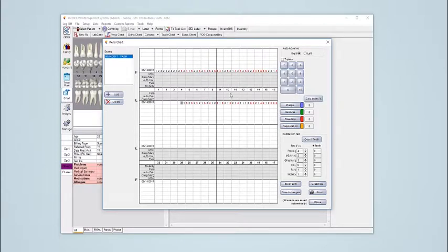Alright, now these are the readings. If you want, you can use the triplet. The triplet will help you enter 3 numbers at a time. If the reading is the same, I don't need to enter the same reading all over again and again, so it will help me add the same reading just like that.